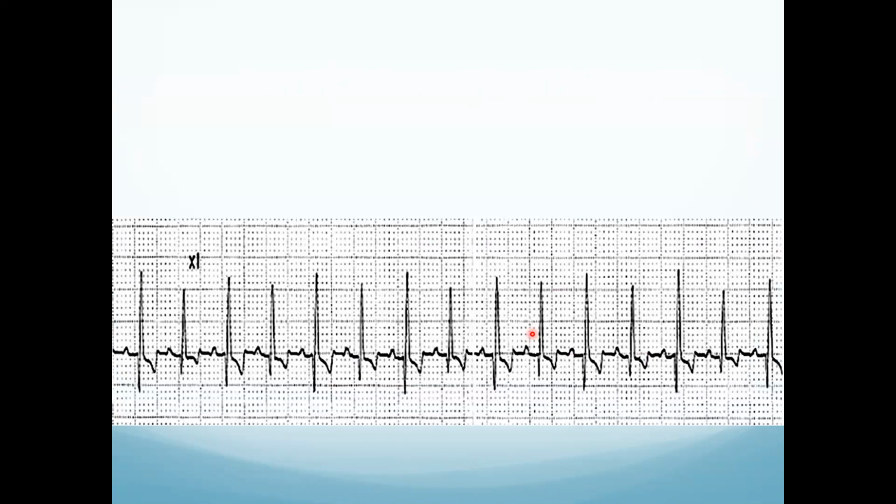And this is our very last example of this evening. I know I've slightly run over time a little bit. And so here, does anybody want to hazard a guess of what we're looking at here? I'll tell you that the rhythm is okay.